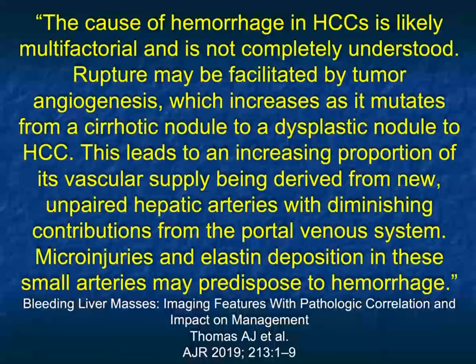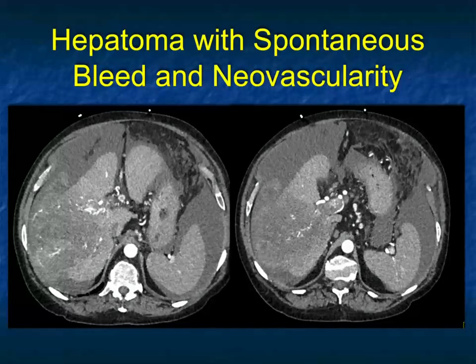Now that is very good science, but I will tell you it's not going to help me looking at a hepatoma saying I think this lesion has a chance of bleeding. So let's look at some examples.